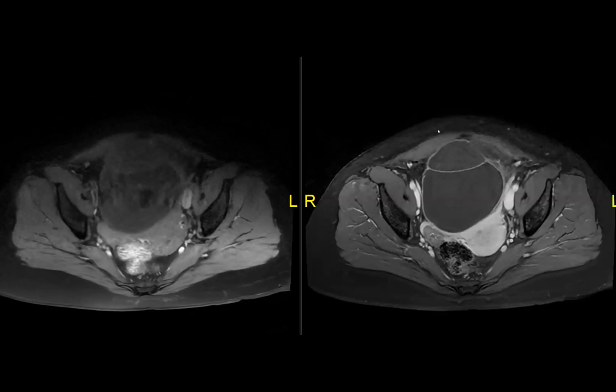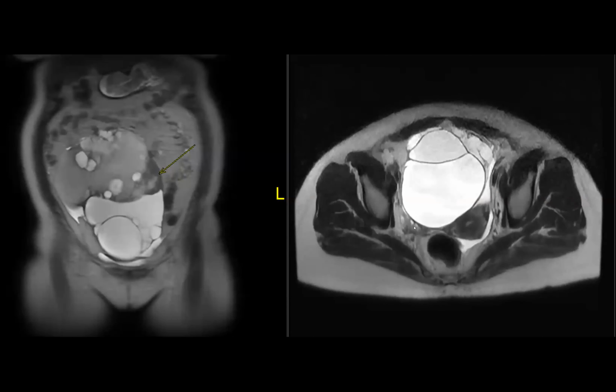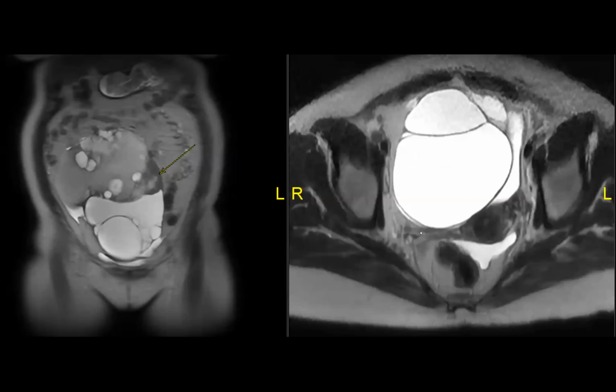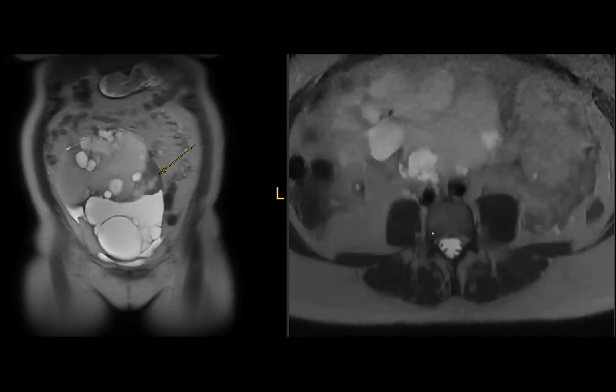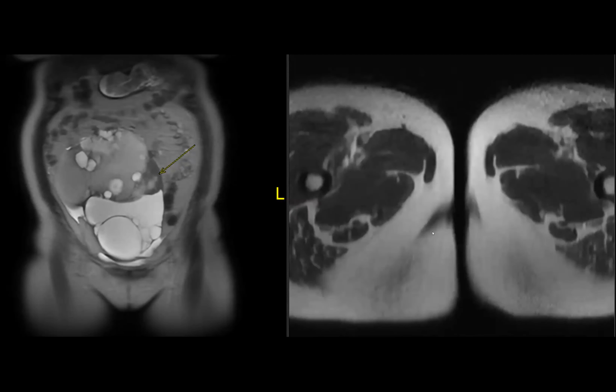Can you show the T2? Sure. Those Brenners are supposed to be in the T2 dark solid part. Yeah, but this looks just like normal parenchyma. I went back, and there's no DWI here, by the way. This is an outside study. Another interesting part here is that they actually took out the appendix, and the appendix had borderline mucinous neoplasm as well.